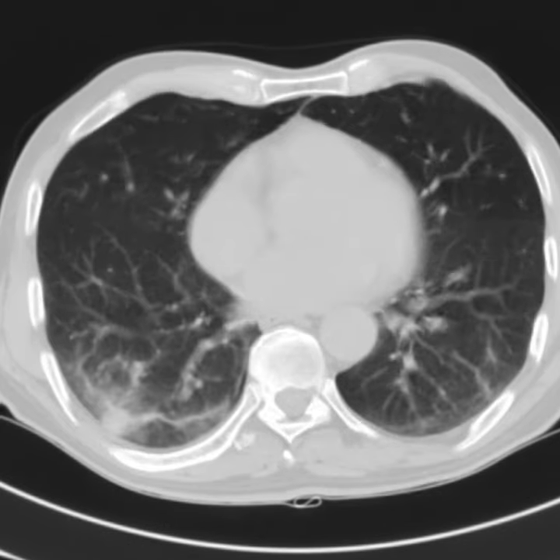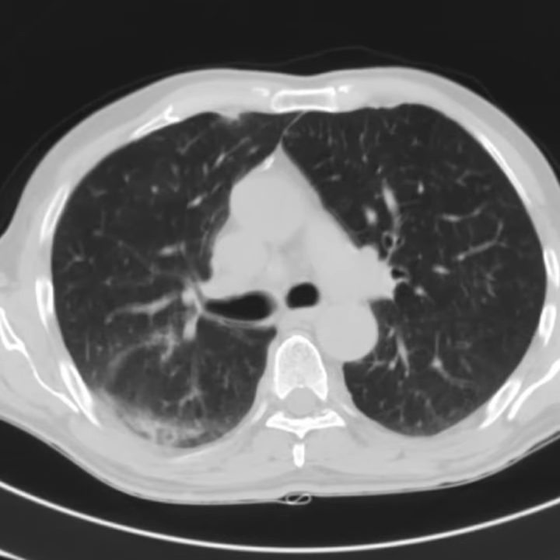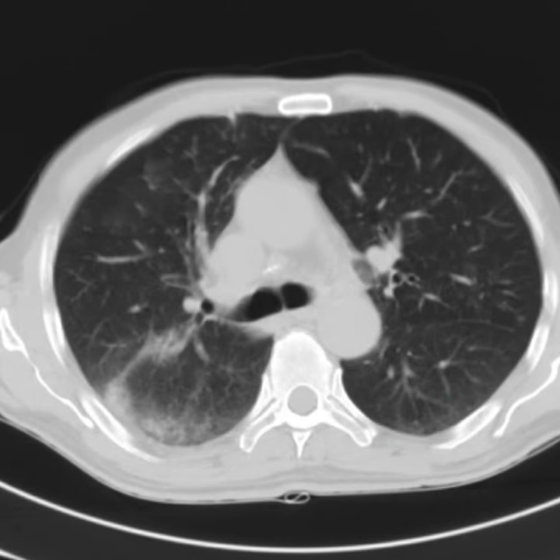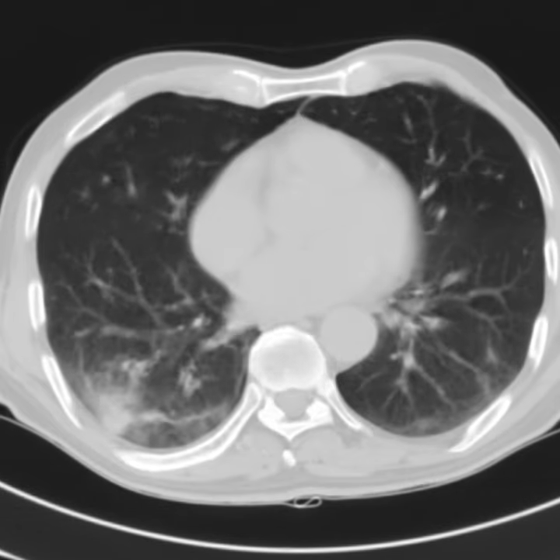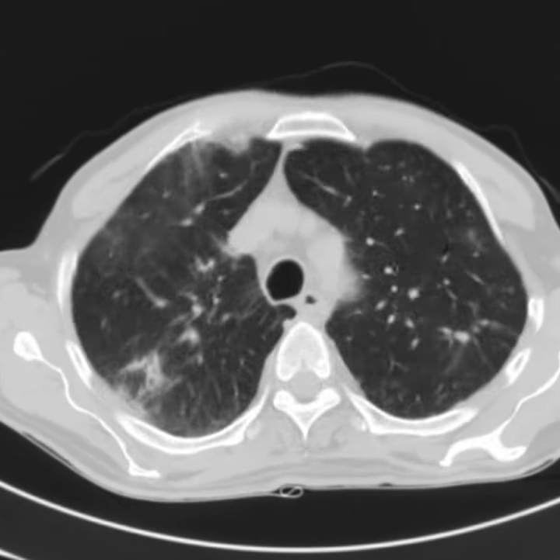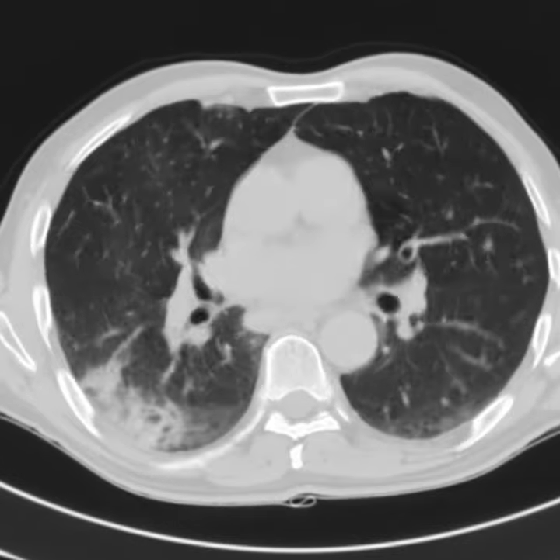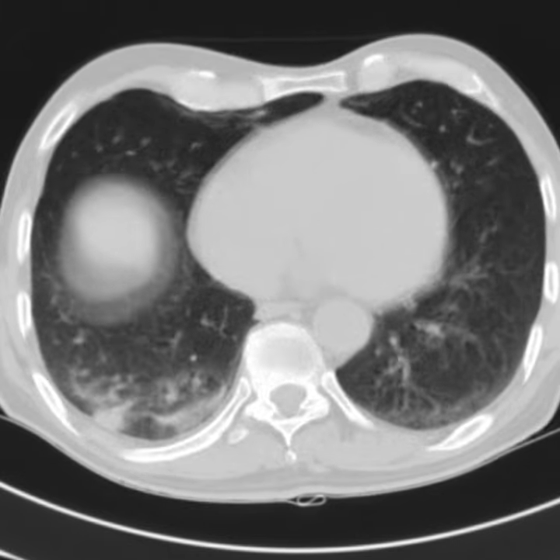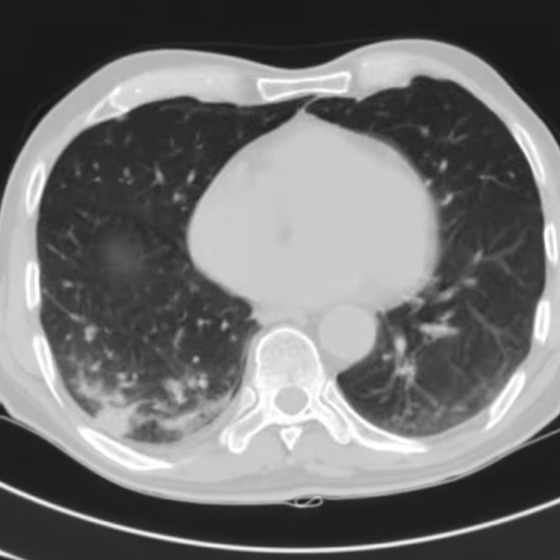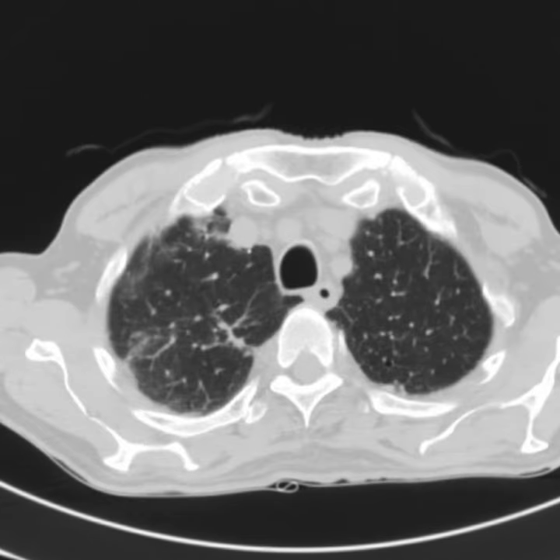Well, I would say atypical viral pneumonia. Can you name a specific viral pneumonia? I am afraid to say it, but I'm thinking of COVID-19 pneumonia. Why are you afraid? You're absolutely correct. This is a case of COVID-19. Although it's been under control, we need to not forget the features that COVID-19 causes.